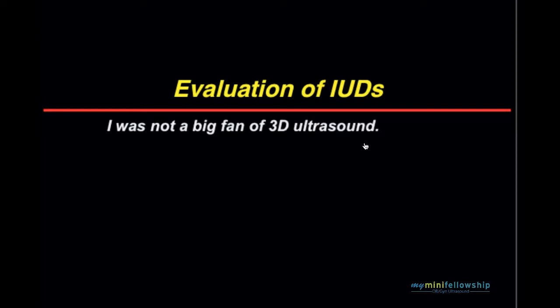So, in evaluating IUDs, I was a very big fan of cine clips. And I think that anybody that looks at these with static images only needs a lesson in ultrasound. If you're in charge or working in a place that doesn't record cine clips, start yelling on Monday morning that you want cine clips recorded.